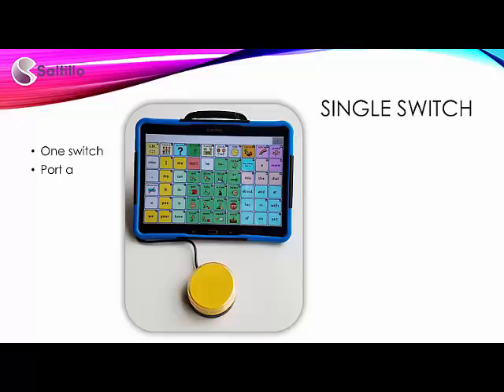The screen may also be set up as a single switch. If the user can accurately hit the switch when they want to, then single switch scanning can be a quick and easy selection method and requires the identification of only one reliable switch site. Considerations with single switch scanning require the client to anticipate the timing of a scan and be able to activate the switch with consistency. With the concentration and physical control required, it may be important to adjust the speed of the scan to meet the needs of the client.